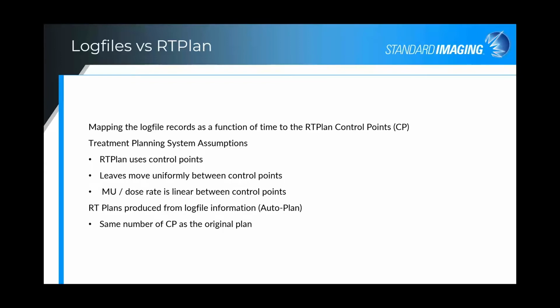After or as the mapping is done, the analysis takes place. The fluence calculation is performed based on the RT plan and the measured parameters collected during delivery by the Linac, as listed in the log file from measurements in the Linac control system. The 2D fluence can be analyzed using the traditional gamma analysis between the planned and delivered treatment.